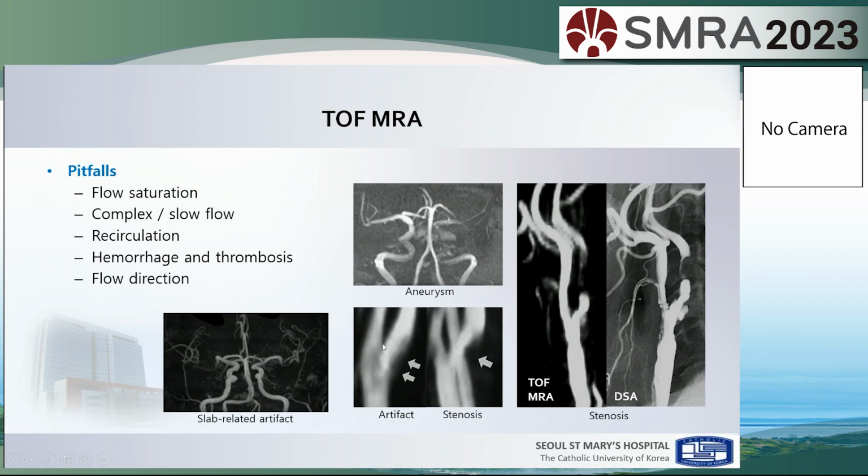And sometimes we have the recirculation artifact at the posterior aspect of the carotid bulb that can simulate stenosis, without any real stenosis here. And to get an arteriogram, we kill the venous flow from the opposite side, but sometimes we do have arterial flow from above toward the cardiac direction.